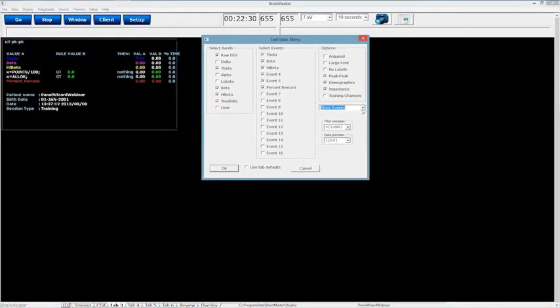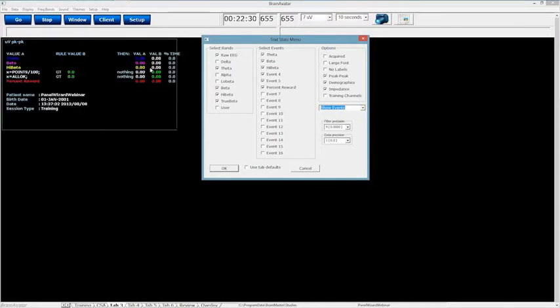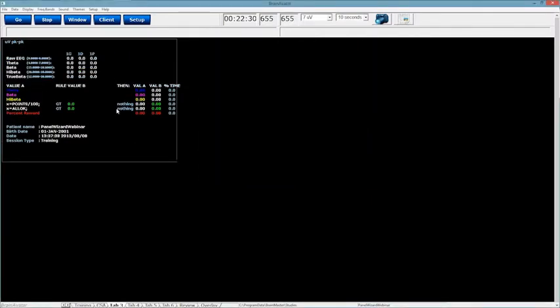There are a couple other features in here. You got the ability to show and hide events. For example, if you only want to look at event A, you can choose to hide everything else. You can choose to only show event B on different graphs, and you can just hide them in general, or you can show them in general. So it gives you a nice extra step that you can do on things like that.